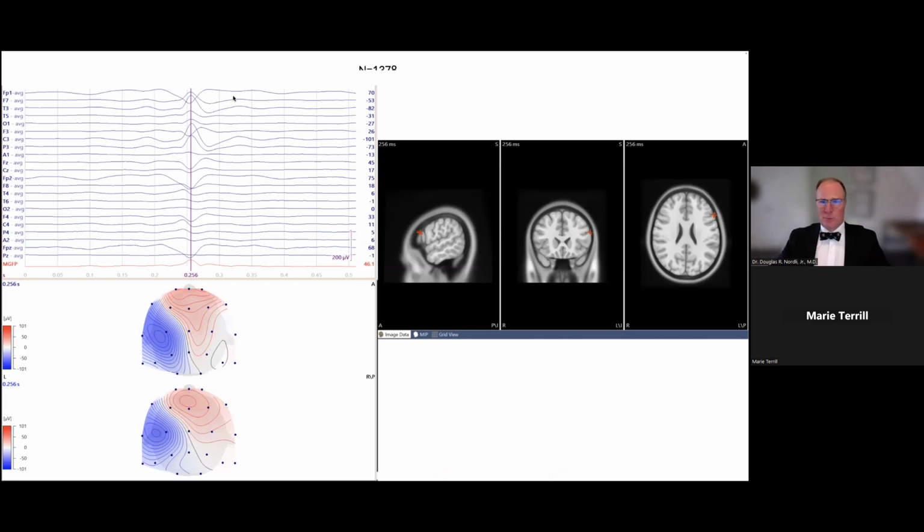Here is a different example, not that same patient, but another patient that has Rolandic spikes. And I just did this just to show you. This was a case that had many, 1,378 spikes. And the reason I wanted to point it out is look at the ellipsoid. So that's the ellipsoid, right? Which you can barely resolve. Look at the map. This is the actual map. That's the map that the computer is going to utilize for the source localization. Pretty darn good fit. And you can see the result of that.